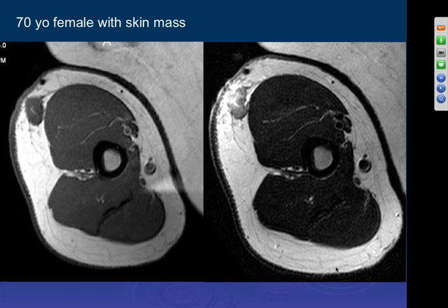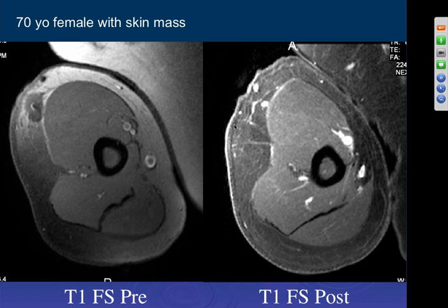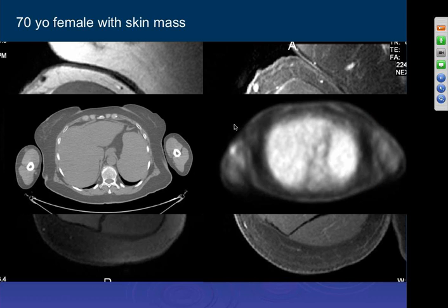Okay, a superficial skin mass, it's fairly isointense to muscle on T1. There are some slightly irregular borders. It's heterogeneously high signal on T2. I don't definitely see a tract connecting it, and it doesn't look quite cystic. Gosh, this could be a liposarcoma. There's a vessel that looks like it's communicating with it, so I guess it could be a superficial lymph node that's inflamed. Could be a foreign body. I'm not sure.